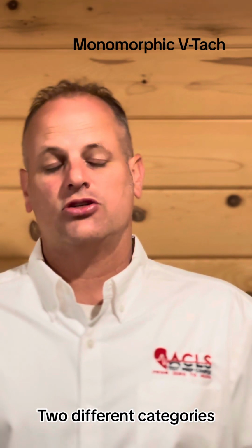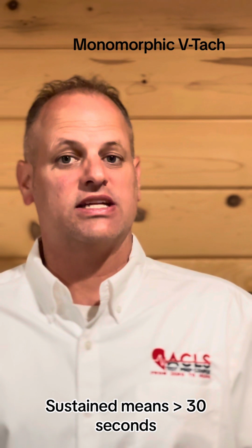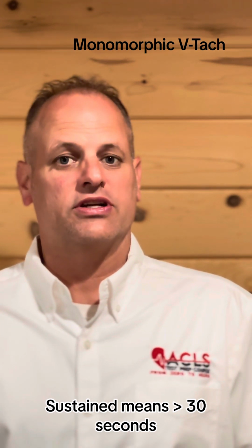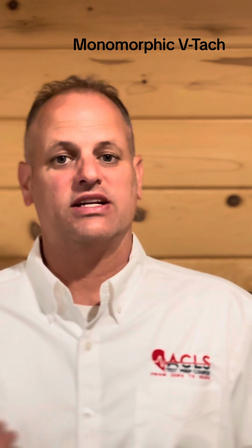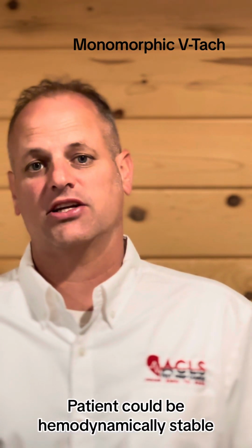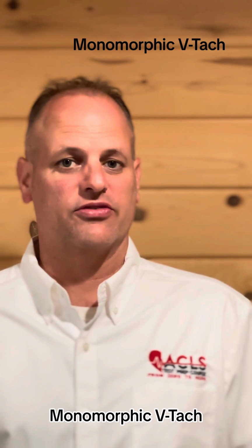Now, V-Tach is in two different categories, sustained versus non-sustained. Sustained means that the V-Tach has run longer than 30 seconds. Now, this is transient, it can come and go, and when it does, you want to measure how long they were in V-Tach and how many times. Believe it or not, your patient could be hemodynamically stable and be in monomorphic V-Tach.